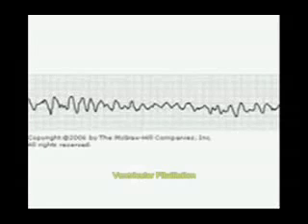In fact, you can see in this EKG ventricular fibrillation. This is a medical emergency. So this needs to be treated, and the main treatment is defibrillation. So in ventricular fibrillation, ventricles are not producing any output. Thank you. I hope you enjoy these EKGs.